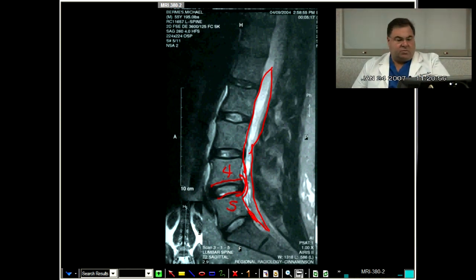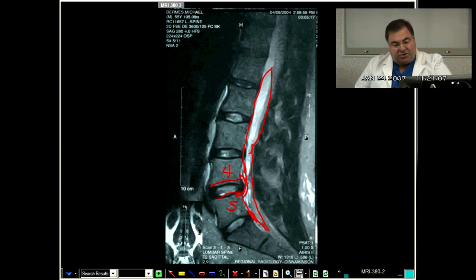Now, what are the consequences of having a disc bulge that impinges upon the thecal sac? Well, there's neurosensitive structures all around there on the outer annulus, this portion here, and also around the thecal sac, so it certainly can create pain. And now, is this the type of condition that you regularly treat in your practice? Yes. And what are the various modes or ways in which this can be treated?